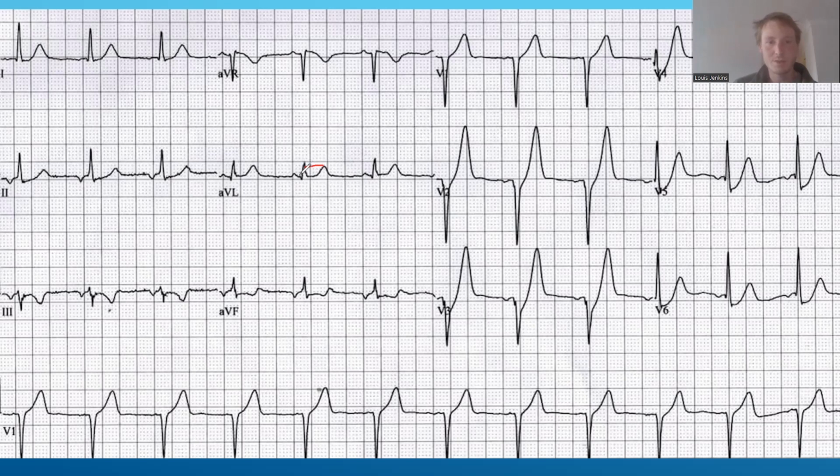And we have a small Q wave here, which is fine. Inverted P wave in 2, no idea why that is. It might be that there's some structural changes to this patient's heart. It could also indicate that we have a different foci of our atrial beat. It's not coming from the SA node. I honestly have no idea. If anyone's got any strong ideas, let me know.